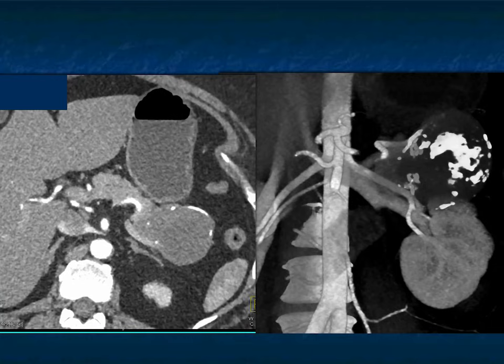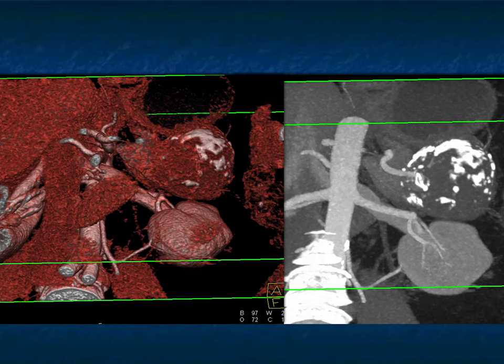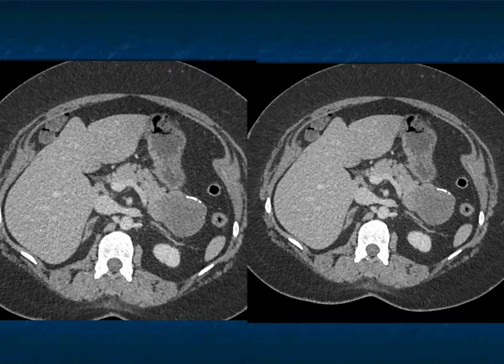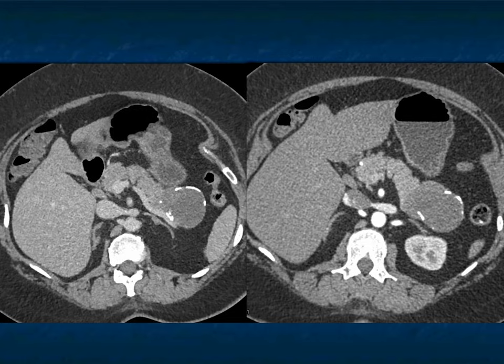Usually it's women in their teens or 20s, but we've seen them in 40s, 50s, and 60s, and even in their 70s. Old hematoma, I'm thinking about, this is calcifications in a mass, and I'm going to favor a SPEN tumor. I would consider neuroendocrine, but again, it's not vascular. MCNs can calcify, and it's not a bad location. MCNs usually more body than tail, but it's close enough. Again, a few more images.